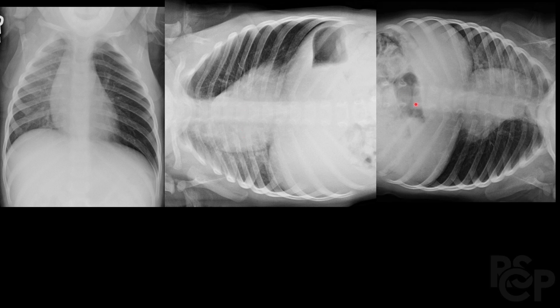And then this was in the left decubitus view, so the left side is downwards. And what we notice is the air trapping is preventing the lung from partially collapsing that we saw over here. So this means there's a foreign body obstruction in the left lung, which is preventing its collapse. So that's why the lung was asymmetrically hyperinflated and it did not collapse as it should have as compared to the right side. So thank you guys for watching this video, and I hope it was helpful.